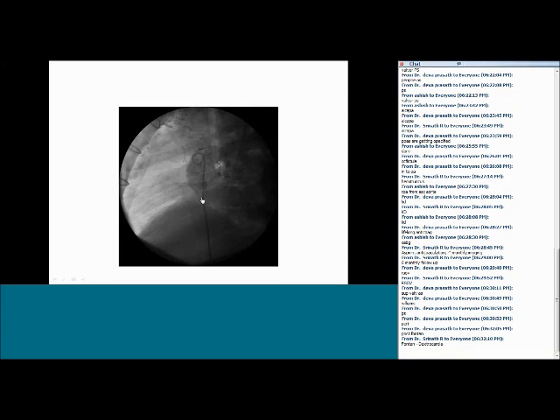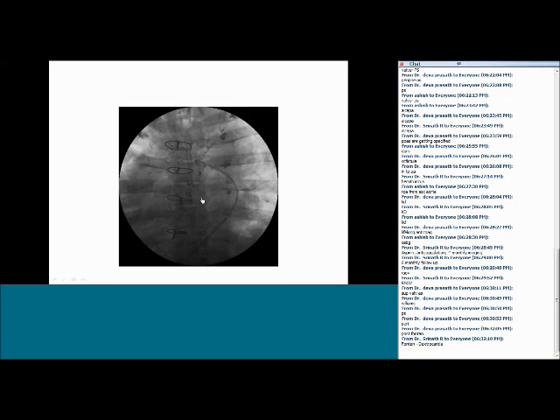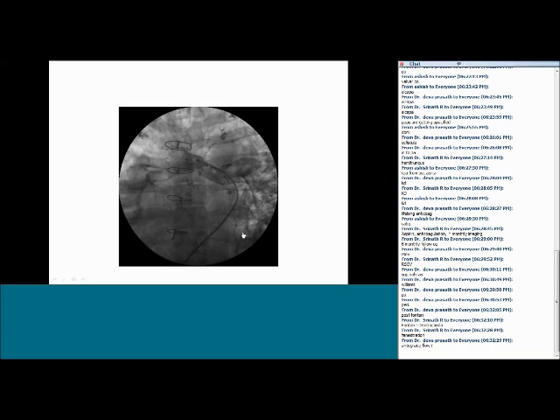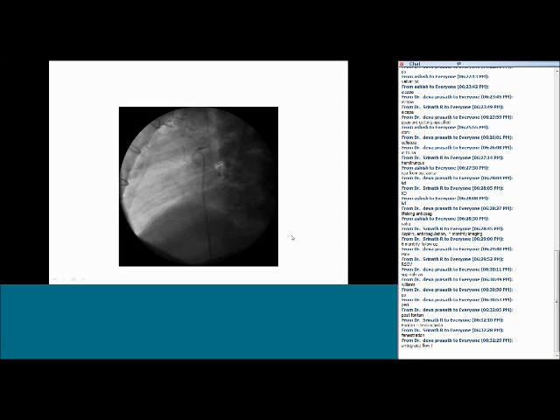Something else you can see in this particular angio. The previous one, this one, that particular thing, yes, fenestration. That's the correct thing. And what are all these? These are all post-coil embolization. So this patient had several episodes of hemoptysis and had to undergo several sittings of coil embolization.